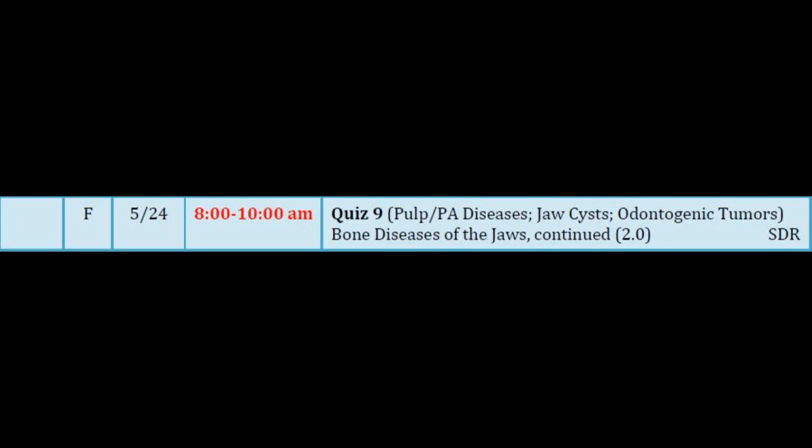It's distorting the nose. It is encroaching into the palatal space as well as going outward, so it is 3-dimensional, not just anterior to posterior. And here we have a nice round lesion that on a pano is hard to decide if it's lucent, opaque, or mixed. It's a little bit ground glass in this part, but it's increased density compared to normal bone, I think. What about this one?